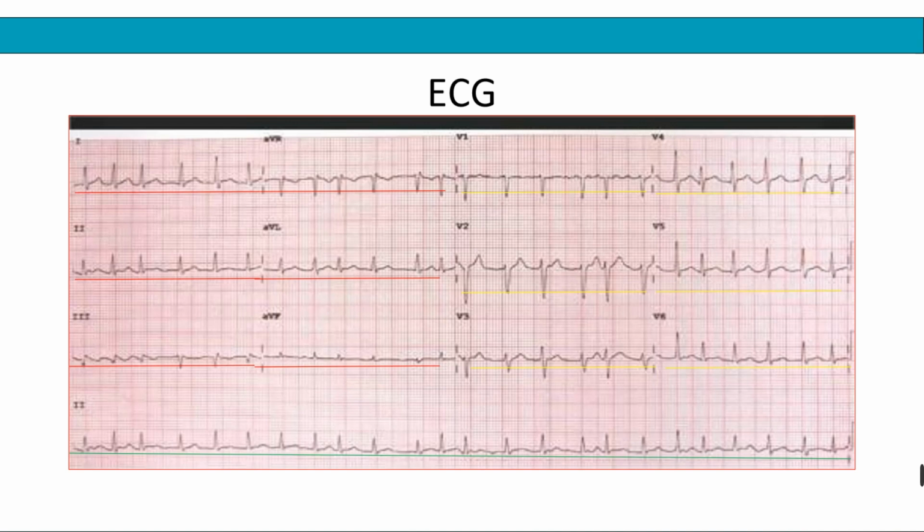Because if it's not a regular rhythm, the reading of the heart rate is different from if it is regular. So let's try to determine if the heart rate is regular. That is determined using the rhythm strip. The rhythm strip is this strip that is underlined here in green, and the rhythm is determined by the frequency and regularity of the QRS complex.